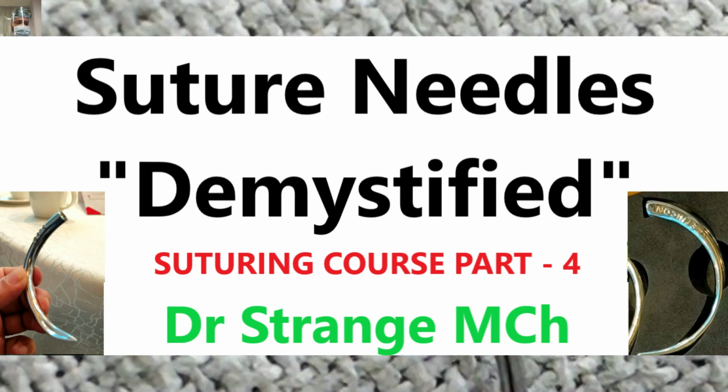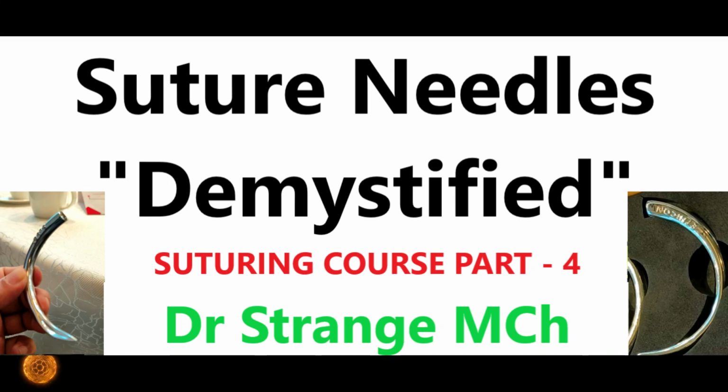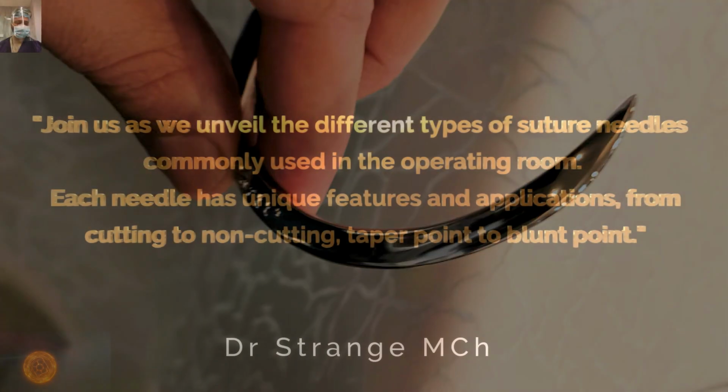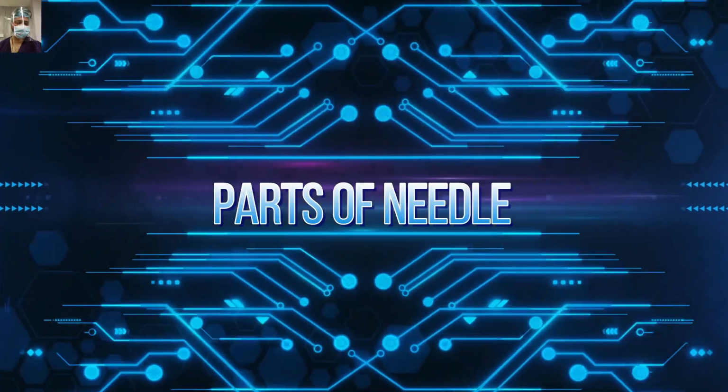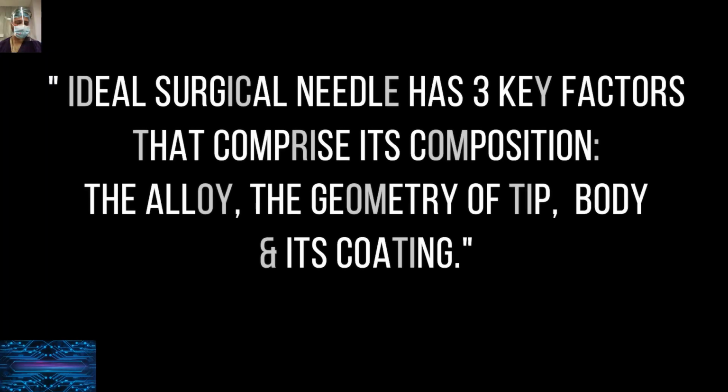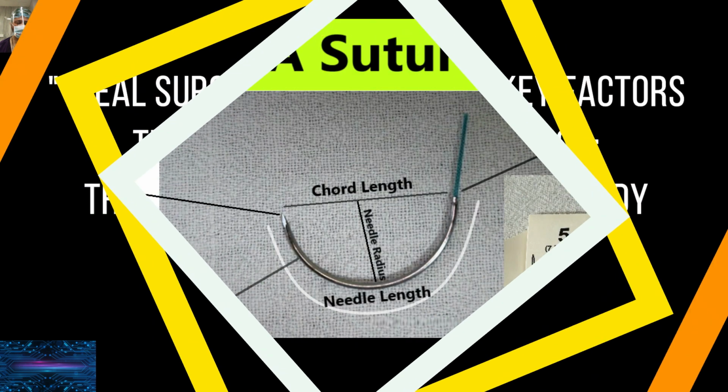In this part 4, we are delving into the critical aspect of suturing, that is, the different types of suture needles. So, let's start first with parts of a needle. Ideally, there are three factors which decide the quality of a needle: the alloy, which is the material it is made of, the geometry of the tip and body, and its coating.